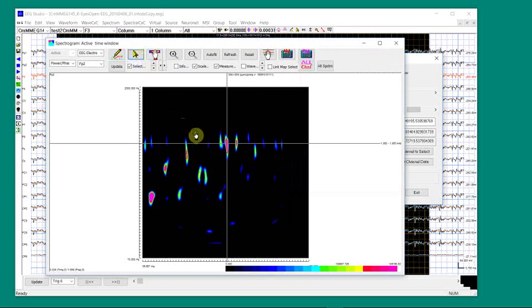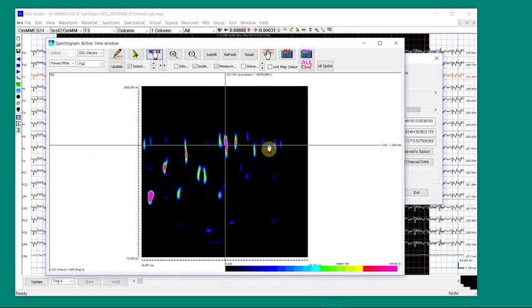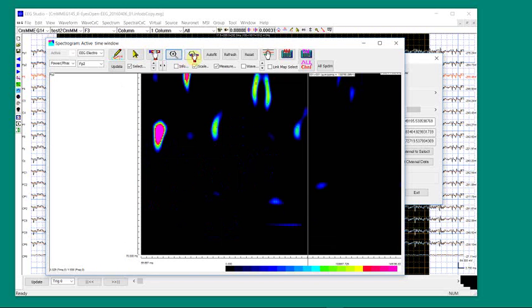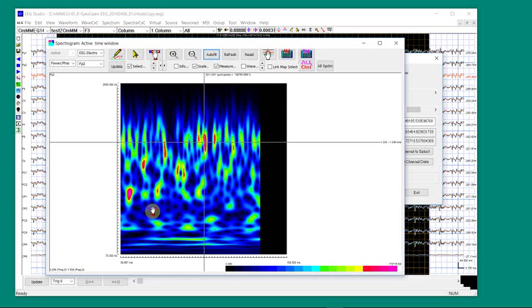You click this one, that means measure them. If you click this one, it will move left or right, up and down. Of course, you can zoom in, zoom out. You can fit, and the program automatically calculates the fit. You can refresh them, you can reset them. Basically, reset this is 0. And you can uncheck the selection, so the select line is gone. Only when you click this one do you get the selection line.